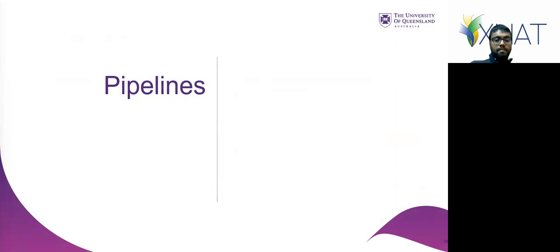So we'll have a look at pipelines. I might just quickly address this question. What kind of download speed should we expect? That is a tough question to answer, I think. The service is hosted on a Cloud server provided by Nectar. So whatever throughput we can put via that service is basically it. And it also depends on your download speed connections.